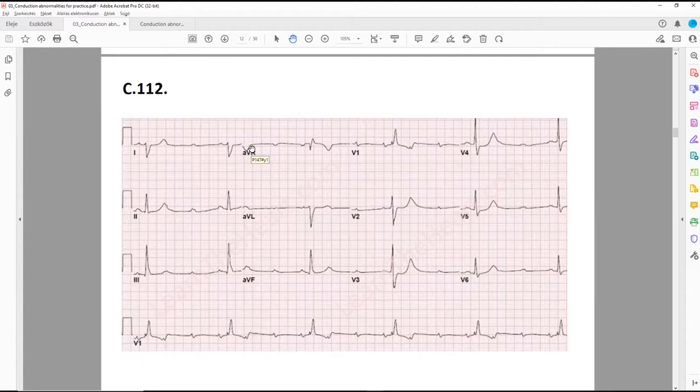Okay. And this is sinus rhythm, and the QRS is wide. Before we do the sinus rhythm: P, P, P, P, P, P, P, P, P. So it's 1, 2, 3 QRS. 1, 2, 3 QRS. 1, 2, 3 QRS. 3 to 1 AV block. Exactly. So the high degree AV block, and now you can get to the QRS complex that is wide.